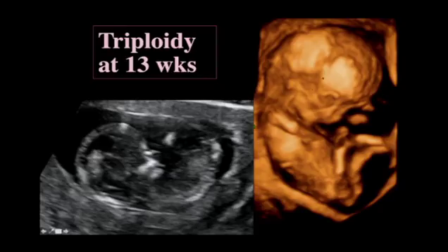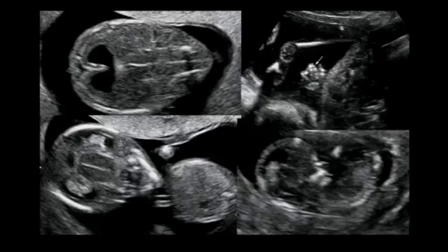And you can see here that the fetus is very, very skinny and looks like it's terribly emaciated, which is really unusual at this early stage in the first trimester. There's almost nothing else that will do this. And if you look in detail at fetuses with triploidy, you find lots of abnormalities, as in this case, an intracranial brain abnormality, and also this very small fetus or small body for a normal-sized head. But if you look at the hand, you'll see the syndactyly, which is almost always there between the third and fourth digits.